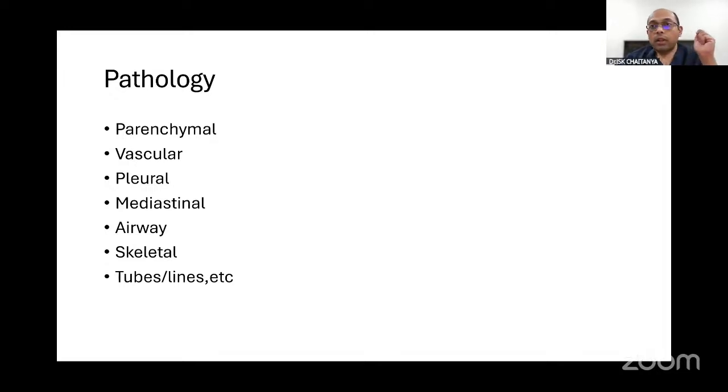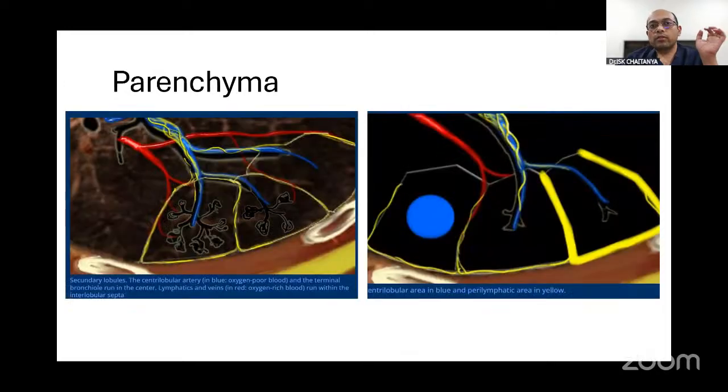or sometimes to understand mediastinal pathologies, where you have to delineate the structures in the mediastinum, whether they are vascular or not, and to understand their anatomy more in detail in relation to the vascular structures. A contrast study will add on, giving us more clear information. So I'll just browse you through a few images and try to explain how the imaging is going to guide us.